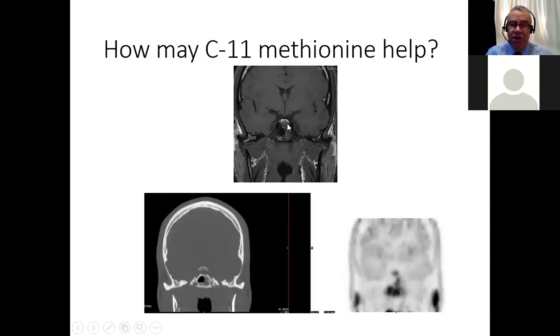So this is the same patient. This is the CT from the PET-CT, and you can see the sphenoid cells here. If you look carefully along the edge and on the top, along here and along here, that's where the residual adenoma is. So we can tell the clinicians that they basically need to go back. Now, you may say, what's this hot uptake? That's in the nasal mucosa, so you don't get confused between that and the pituitary.